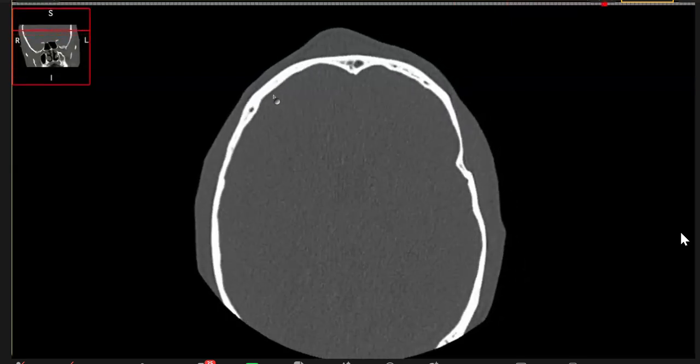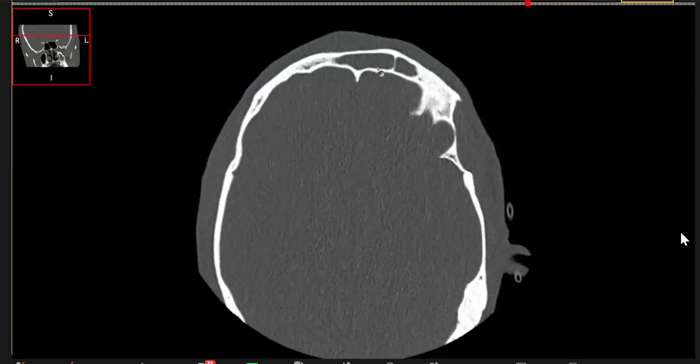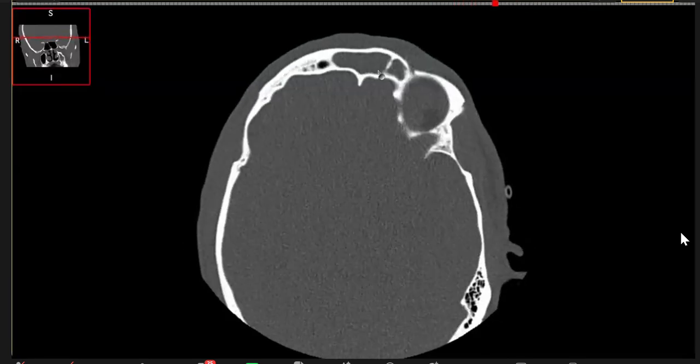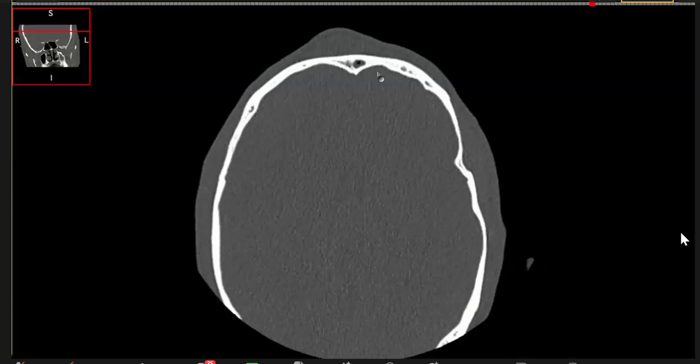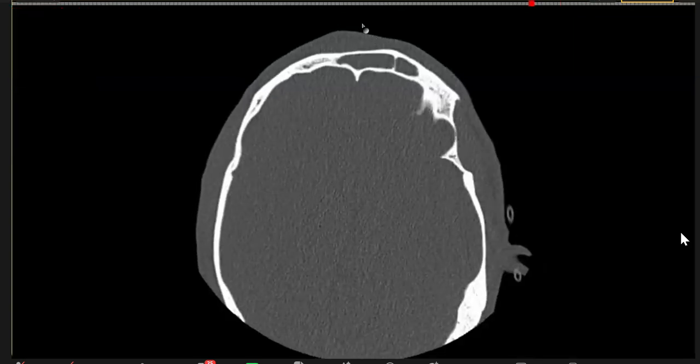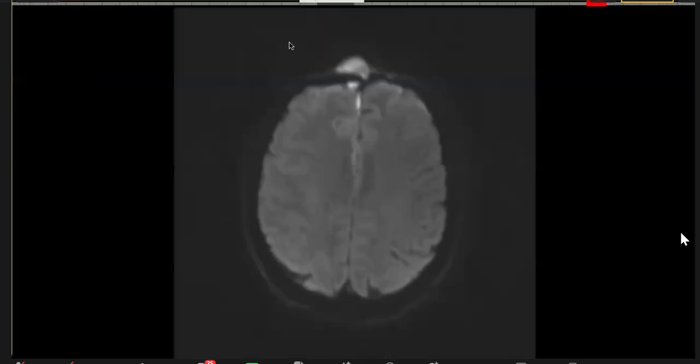But please remember the learning point in this case is that your pertinent negative or positive will be, is there a breach or dehiscence of the bone? That is very critical. And the take home point here is that on a CT scan, you might not pick up or see any dehiscence. And even then, there can be what we call abscess.